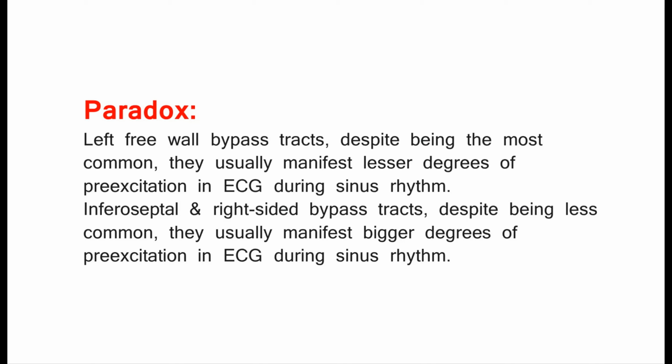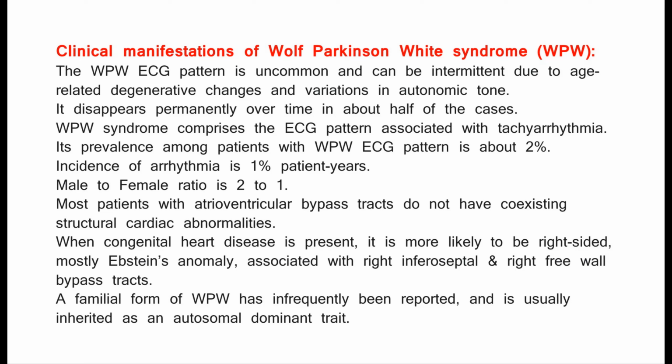Paradox. Left free wall bypass tracts, despite being the most common, usually manifest lesser degrees of pre-excitation in ECG during sinus rhythm. Inferoseptal and right-sided bypass tracts, despite being less common, usually manifest bigger degrees of pre-excitation in ECG during sinus rhythm. Clinical manifestations of Wolff-Parkinson-White syndrome, WPW.